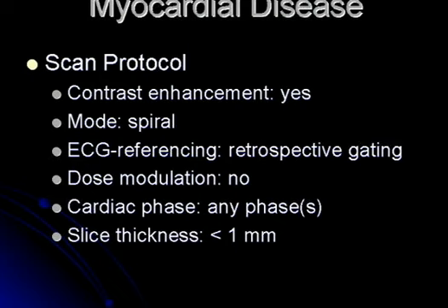Moving on now to pericardial diseases. Normal pericardium is a very thin layer that surrounds the heart. It's normally less than 3 millimeters thick. We're often asked to look at the pericardium for the evaluation of pericardial diseases, in particular constrictive pericarditis. And while CT imaging can give us a great anatomic view of the pericardium, there is very limited hemodynamic information.